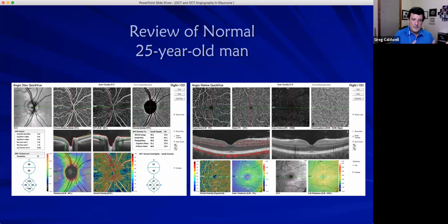To go from spectral domain, still within spectral domain, to OCT angiography, you need an instrument able to scan at about 70,000 scans per second. And if the patient's holding their eye still enough, then really the only thing that's moving is the blood. Through all the programming, if they subtract out what's not moving, then you can see what's happening with the capillaries. That's how that all works. So it picks up on red blood cells, white blood cells, plasma and proteins, everything in blood that's moving, and through the micron network it's able to pick up the flow pattern and subtract the rest out. But obviously, if the patient's moving their eye, it all becomes a blur.